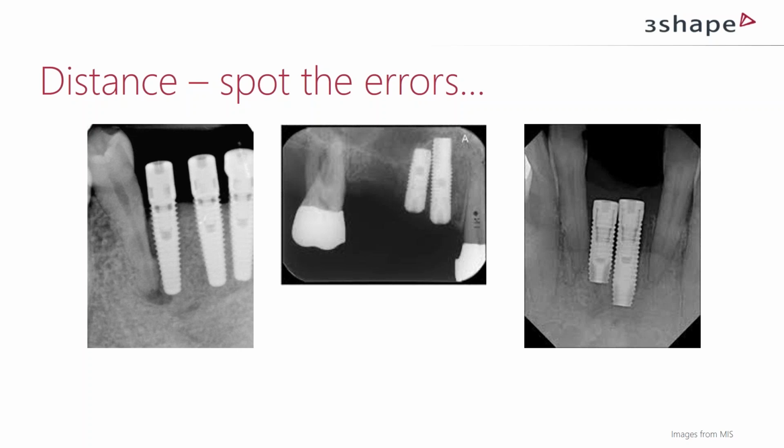The knowledge and understanding of the surgeon really comes into play here, because if you are well trained and have the knowledge, you can see all the problem areas and you know which implant to choose and where to go. But if you are having your laboratory do your planning, like it's very common today, the laboratory has to have this knowledge, and this is not a common area in lab school to learn how to place implants.